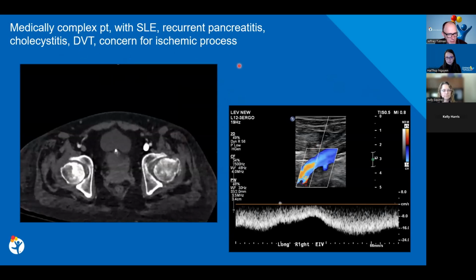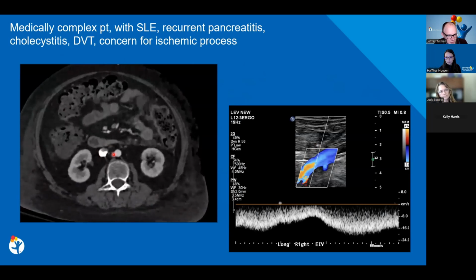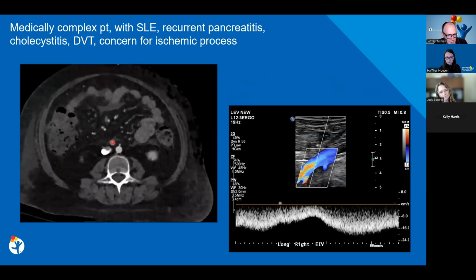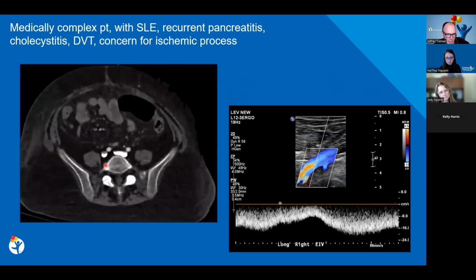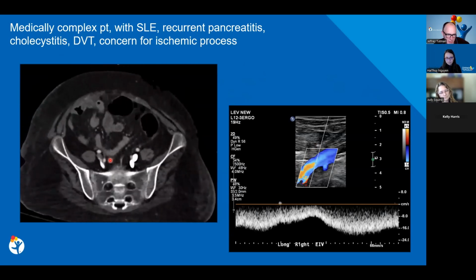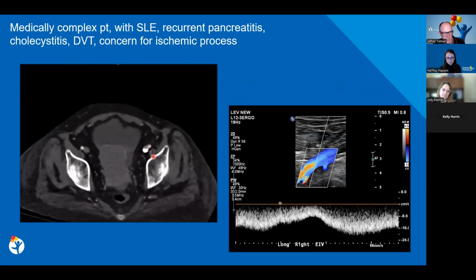Then this was kind of just an interesting case. So this patient had a CT. You can see there's contrast, and this mixing artifact, I think, in the IVC. And then as we get down into the legs, this ended up getting read as an iliac thrombus. It's certainly asymmetric from the other side.